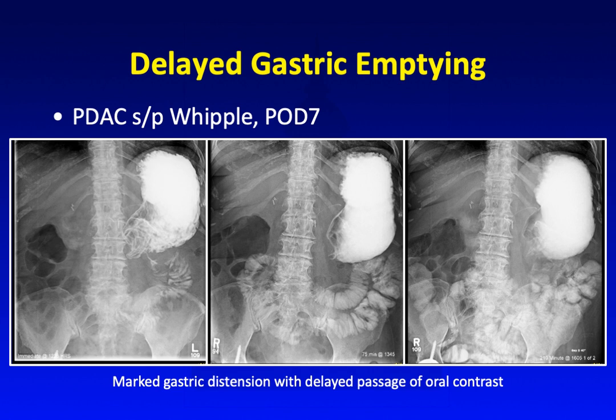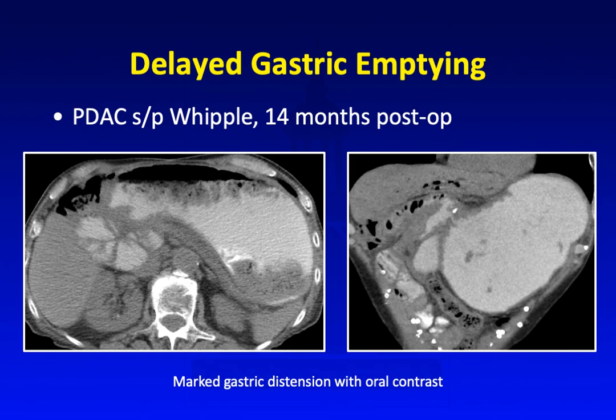And this is the 210-minute delay. We still have a lot of contrast sitting in the stomach, consistent with delayed gastric emptying. This is a different patient who had a Whipple 14 months post-op. And again, we have marked gastric distension with oral contrast material.